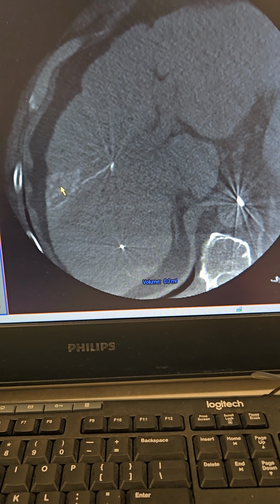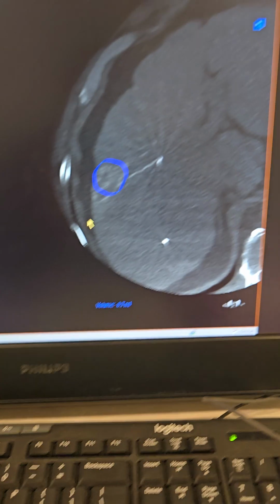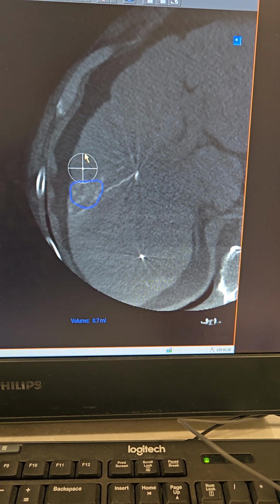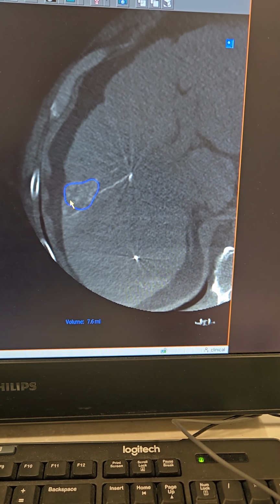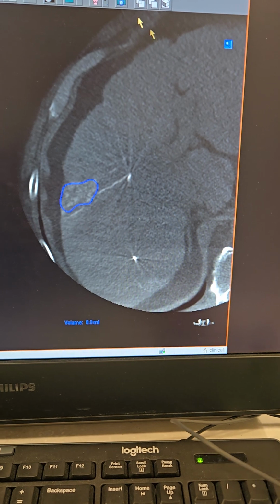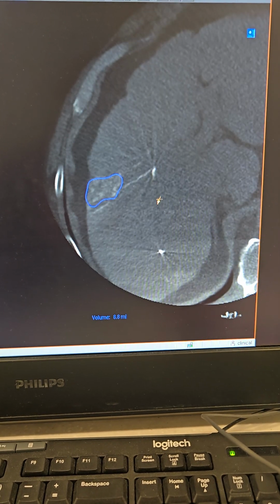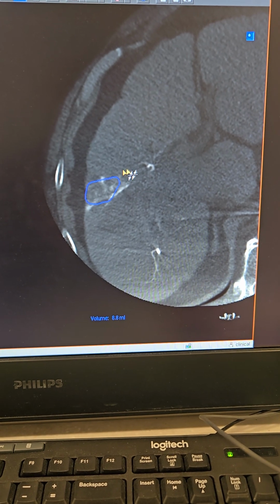So with New being hit, you're just going to use the mouse, left click, and you're going to pull this little circle over the lesion, and you're going to modify it by going on the inside and the outside of the line here. And you're just pulling down with the mouse, and you want to kind of get it just to conform to the shape of the lesion. You're limited to the number of clicks you can do to modify it, so I think it's like 100 or something like that. So if you go over, it just stops letting you modify it.